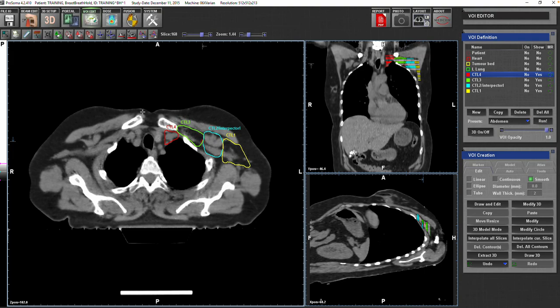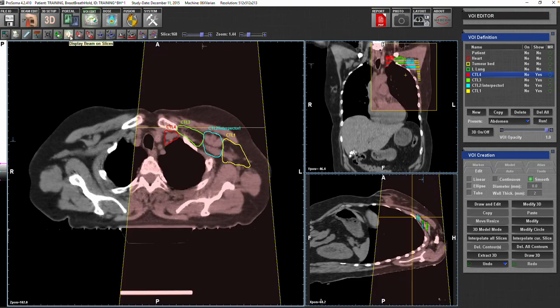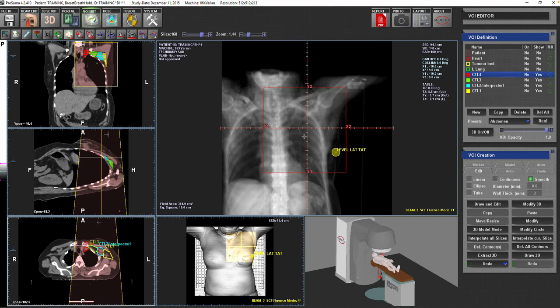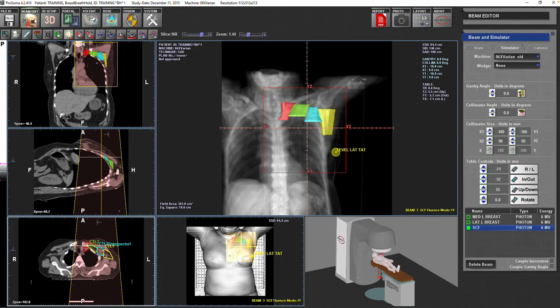But let's have a feel now and look how this drawing or quick way of drawing things will help you to put your field properly. Let's say the radiographer, they gave me the fields like that, because most of us are working on a field-based radiotherapy, and we don't usually draw cut by cut. You look at my drawing. It's beautiful because it gives me an idea about where my field should be located. Basically, we usually use a supraclav with what we call a half beam block. So this is my first step.